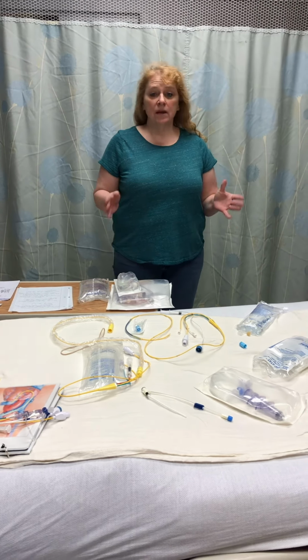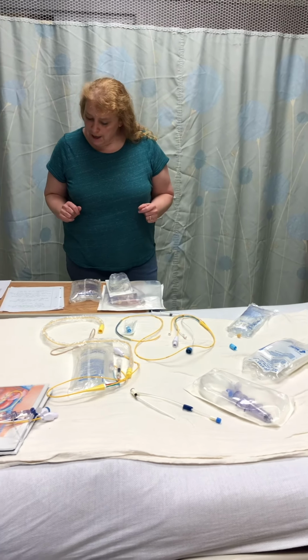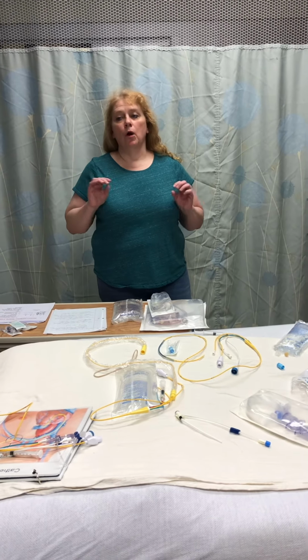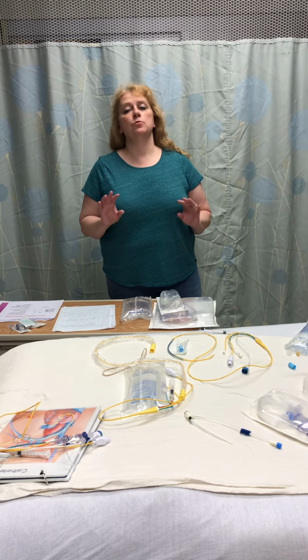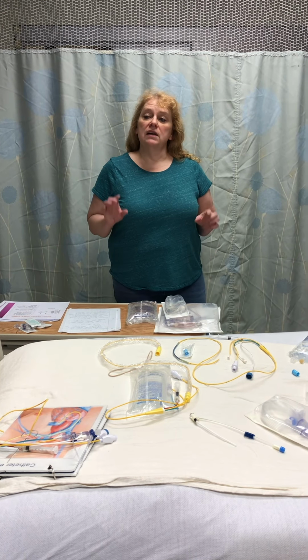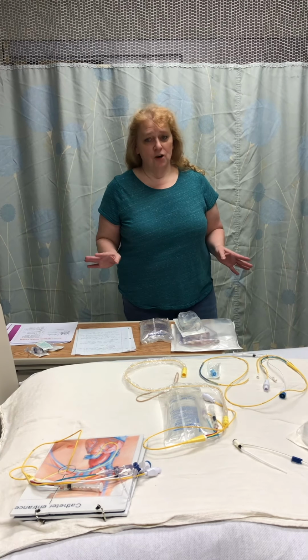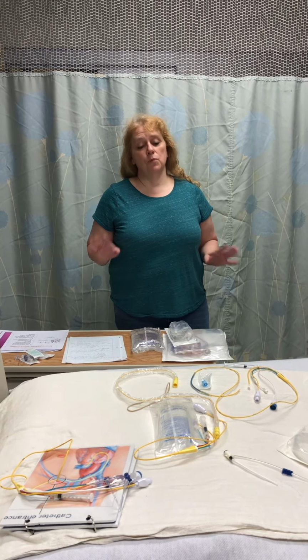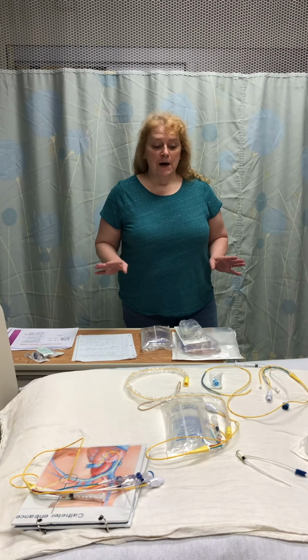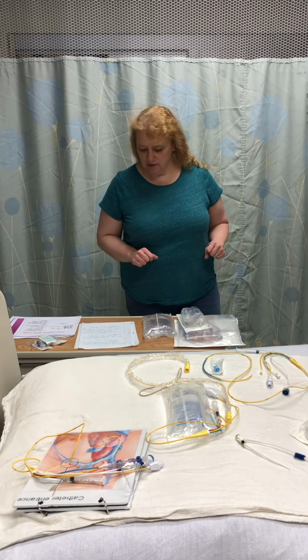Okay, I am here to help you get a basic understanding of our Swan catheter. Like I said, this is just a basic understanding. If you want to get more heavy duty into the hemodynamics and what the actual waveforms and components of the waveforms look like, there is an Advocate educational booklet that tells you everything you want to know about the Swans. This is just basic for most people who haven't seen a lot of Swans, who are uncomfortable with them. But yes, there are other resources if you want to get nitty gritty into all the details of the Swan.